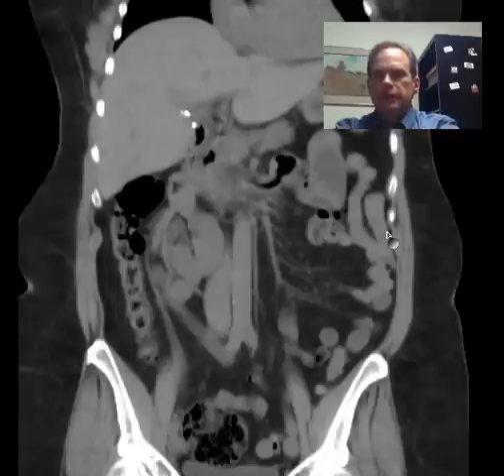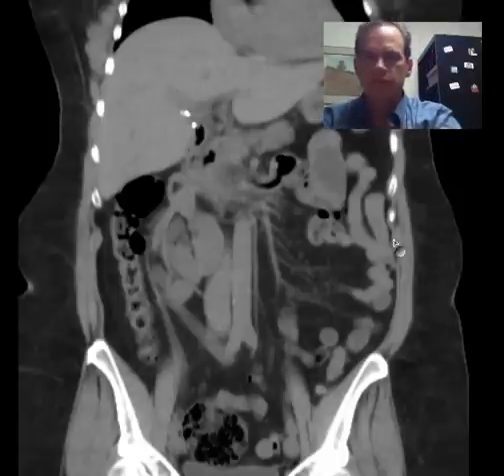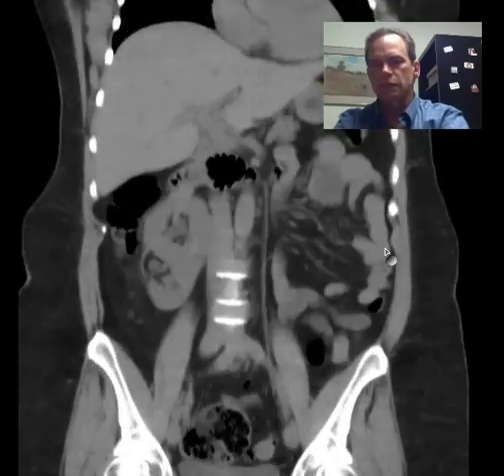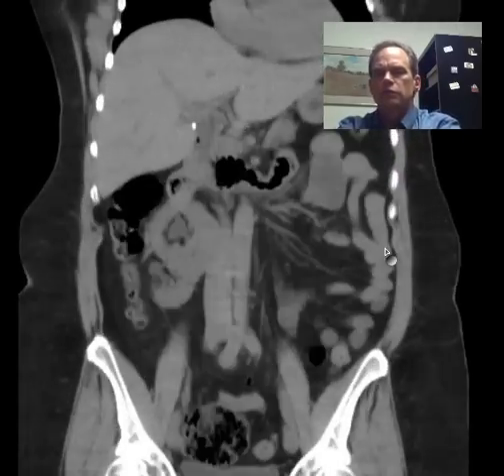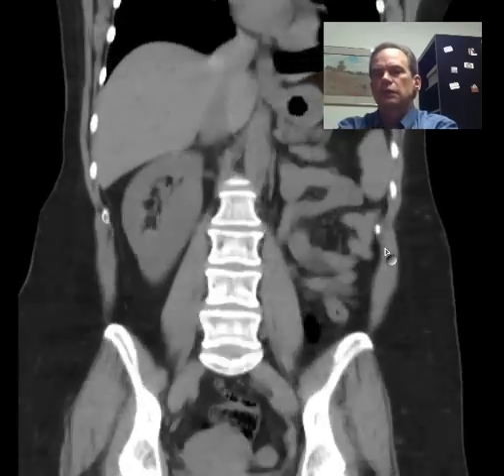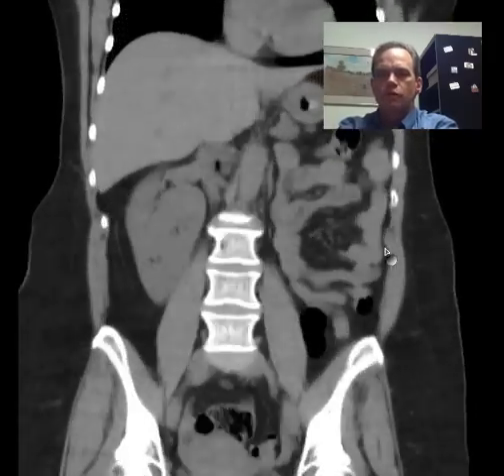Well, I think you're getting the idea that I'm giving you the axial images first because they can be more difficult, although they do facilitate a more systematic approach to this imaging. But I'm going to jump to a coronal right now because I've got an interesting case here that I think looks very clear in terms of what's abnormal on this coronal set.